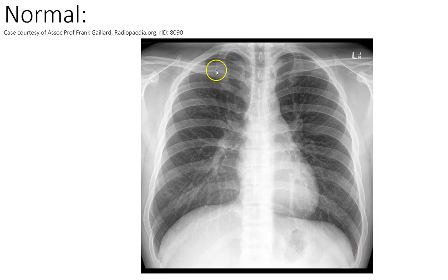Okay, so the next thing I look at, when I'm looking at the positions of the hemidiaphragm and counting the ribs down, is bony deformities, like rib fractures and things like that. I only really look for those if there's been a history of trauma and I'm suspecting there could be a fracture. Otherwise, I don't tend to look. They can be hard to spot, but you're looking for a discontinuation in the line of the bone. So I only tend to look for those if there is actually a history of trauma and a reason why there might be a rib fracture.